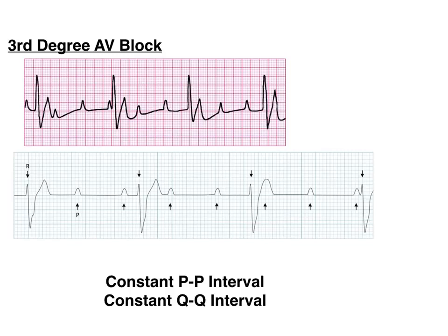Look at the second QRS beat in the first rhythm strip. You see that little thing right in front of it? That's a P wave that's basically buried in the QRS. Now, this is kind of easy to spot because I pointed it out to you, but on the test, it's possible that you're given a rhythm strip. They're going to be bradycardic, again, because it's an AV block. The patient's going to have dizziness.